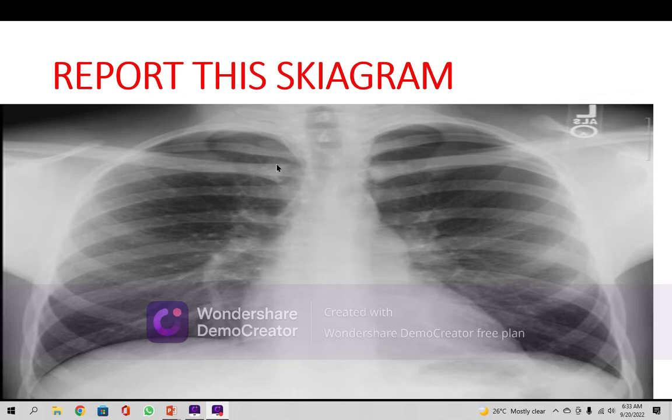One line is drawn here, should be a 90-degree angle, no. He is not straight, he is standing. Why is he standing? Because first rib, second rib, third rib, fourth rib, fifth rib, sixth rib, seventh. In the seventh is the dome of the diaphragm. If it is at the other view, AP view or etc., or he is in a sitting position, then this dome will actually go higher here. It is actually in the position of standing. PA view, this is frontal projection.